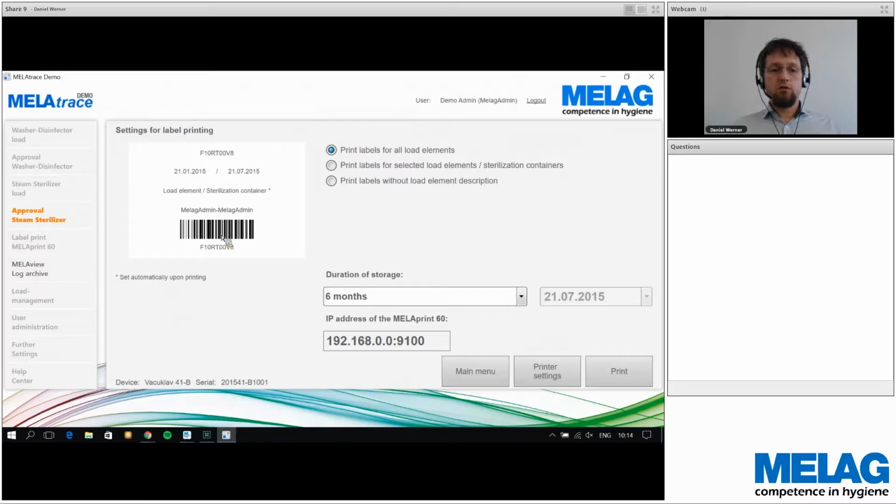And when later on Mr. Miller comes and says, oh, I have now an infection and because of you, then the doctor can open the according patient card, can check the numbers, the barcodes here, can find out the according treatment report and can show the PDF to Mr. Miller in our case, and he can prove that everything is fine in his practice and he is not the reason. So that's the traceability, and that's the easiest way for that.